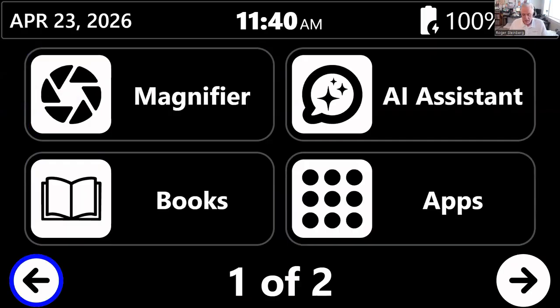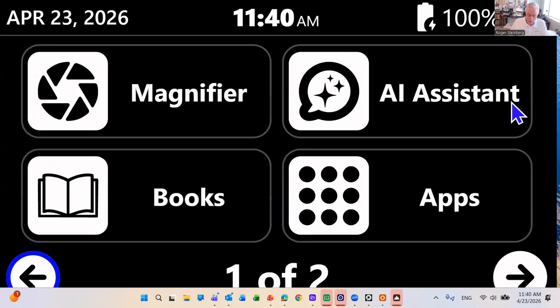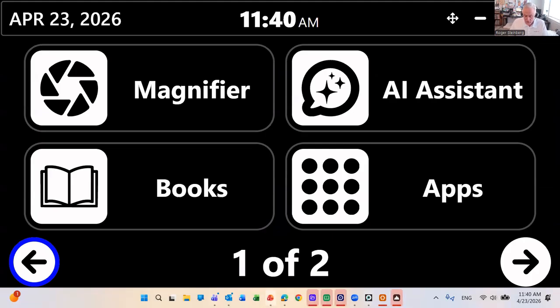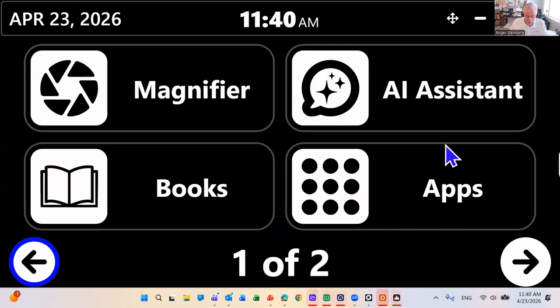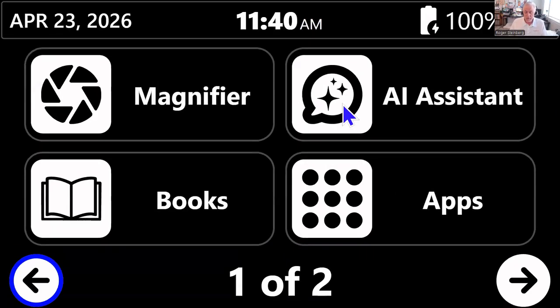So I see that I'm running on time here. So I'm going to come back out and show you a new tool that we've added with version 1.6, and that is called apps. So right now, again, I don't have my Windows interface mode on, and maybe we don't want to have that, but we want to have quick access to apps. So again, Alt-W shows me my Windows interface mode. I can get to my taskbar, but there's often apps that won't appear in your taskbar that you might want to get to quickly, or maybe you want that full screen environment that I've just gone back to.